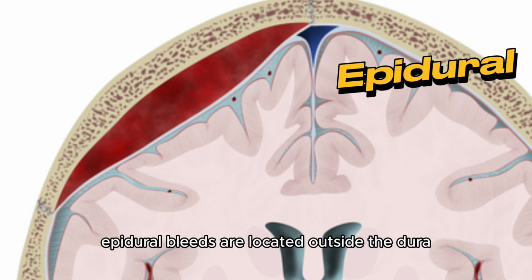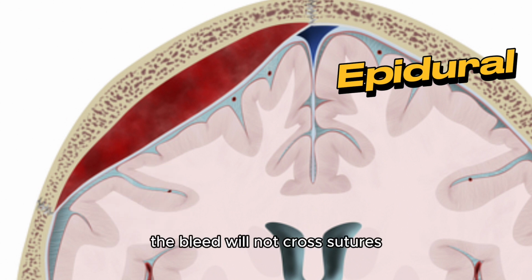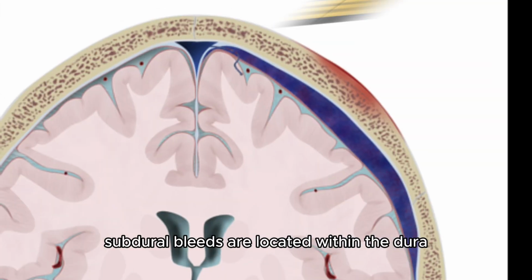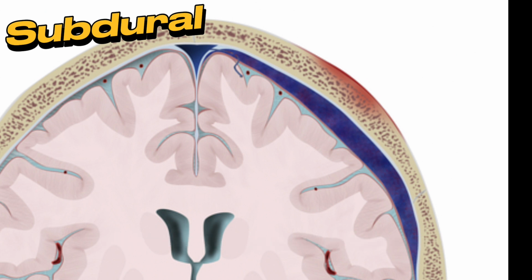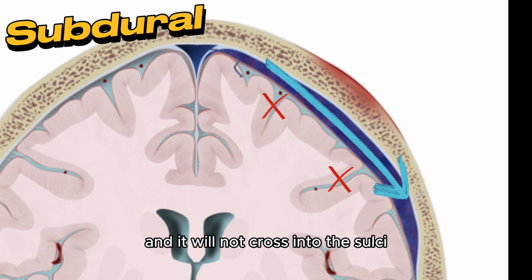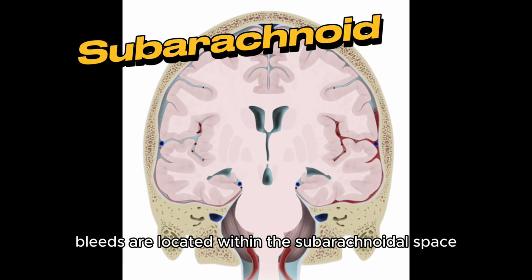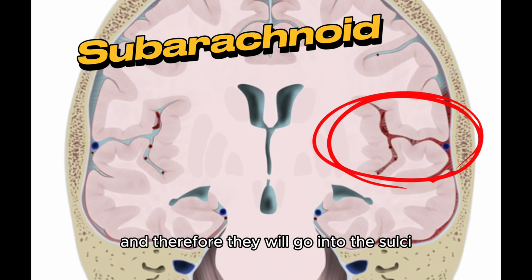Epidural bleeds are located outside the dura, as the name implies. For this reason, the bleed will not cross sutures and tend to form a lentiform shape, a shape that looks quite similar to an apple. Subdural bleeds are located within the dura but outside the arachnoidal matter. This bleed will tend to track along the brain and it will not cross into the sulci. They classically form a crescent shape, quite similar to a banana. Subarachnoidal bleeds are located within the subarachnoidal space and therefore they will go into the sulci.